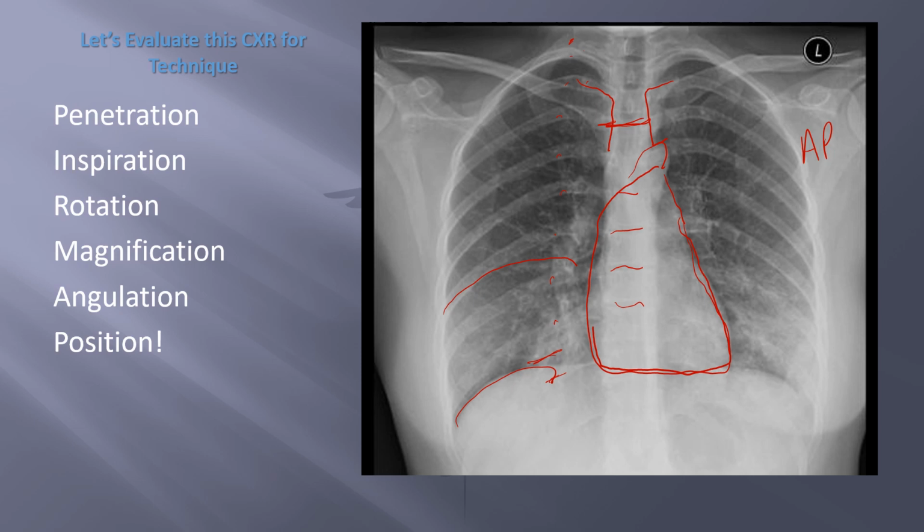When you have a higher angulation, sometimes the clavicle heads will be down here. So just be aware that if things look a little unusual, it may be related to your angulation. So this is a good angulation. This is shot fine. And lastly, I did put here on position.